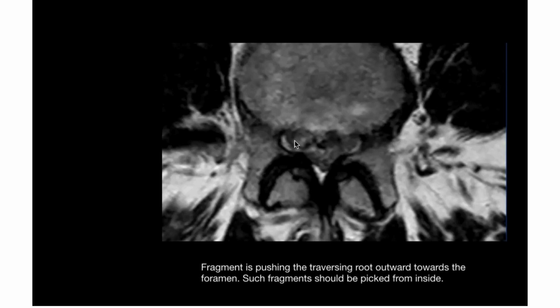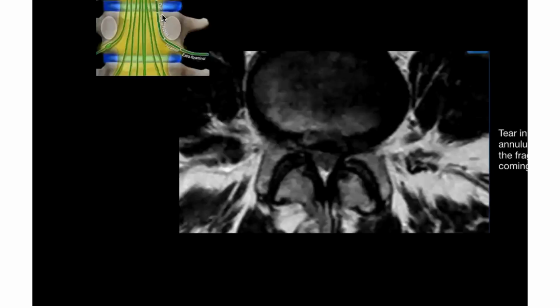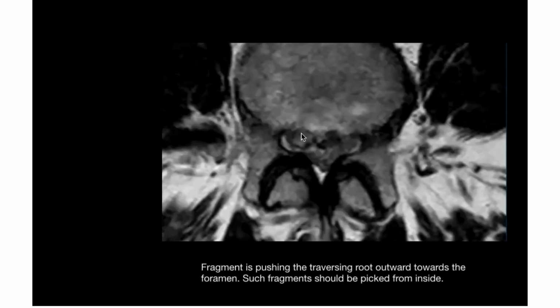The fragment is lying in the lower part of the disc, at the level of the lower vertebral body. This is a fragment which is lying over here.